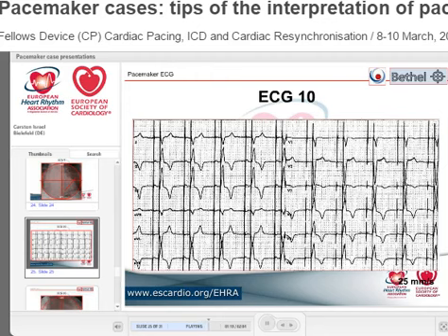So this patient is paced from left to right, you know. It could be in the left heart, but if you are high in the RV outflow tract, the high RV outflow tract is already on the other side of the heart, middle, more to the left. So that is why if you have a negative QRS in lead 1, you are in a high RVOT.